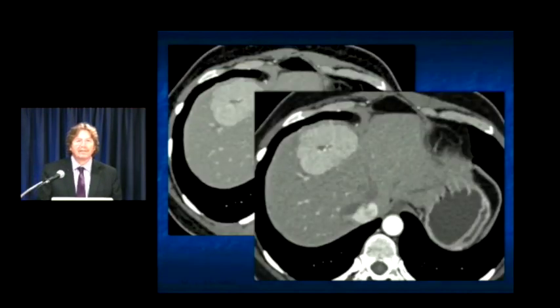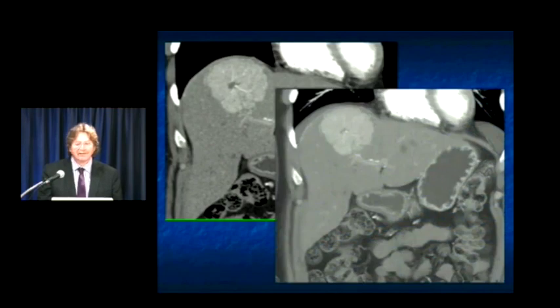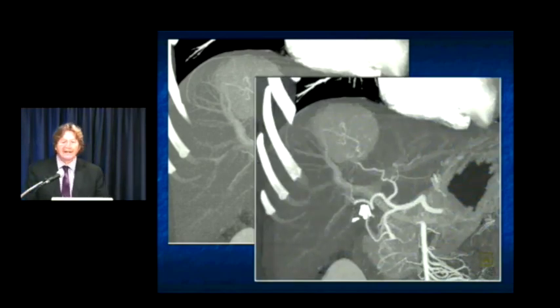Or another example, same disease, FNH. It's a benign lesion, but look at that central scar. You see the feeding vessel going to the scar? I'll accentuate it. There's the feeding vessel. Here I go to a little bit more MIP. There's the vessel right to the center. There's no neovascularity. It's a smooth vessel, goes right to the central scar, classic for focal nodular hyperplasia.